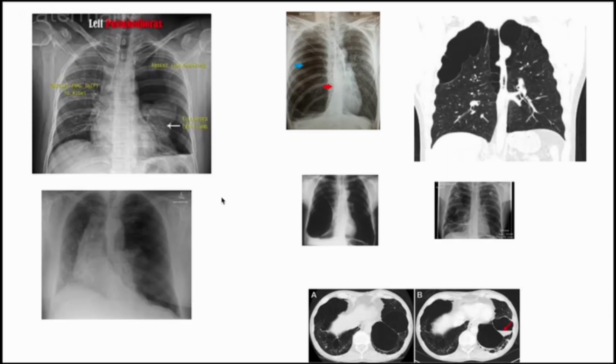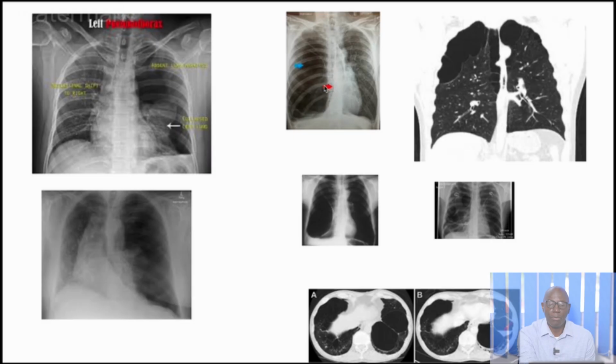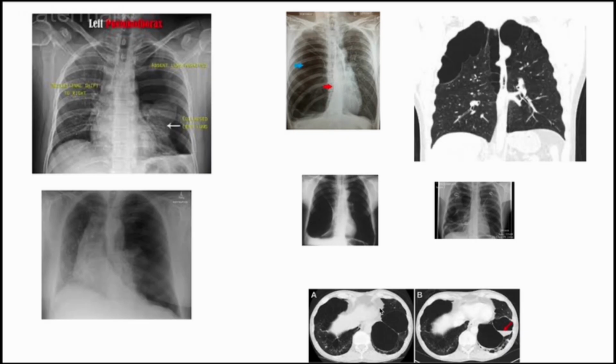We've already talked about some of these, especially hydropneumothorax, pneumothorax, where the lung has collapsed, and what you see, there are no lung markings. Bullae formation, best shown on CT scan, can also cause these paucities. The complicated ones may have some fluid and may be multi-loculated. Here, a CT scan is very important. So that is the possibility when you don't see the lung markings.